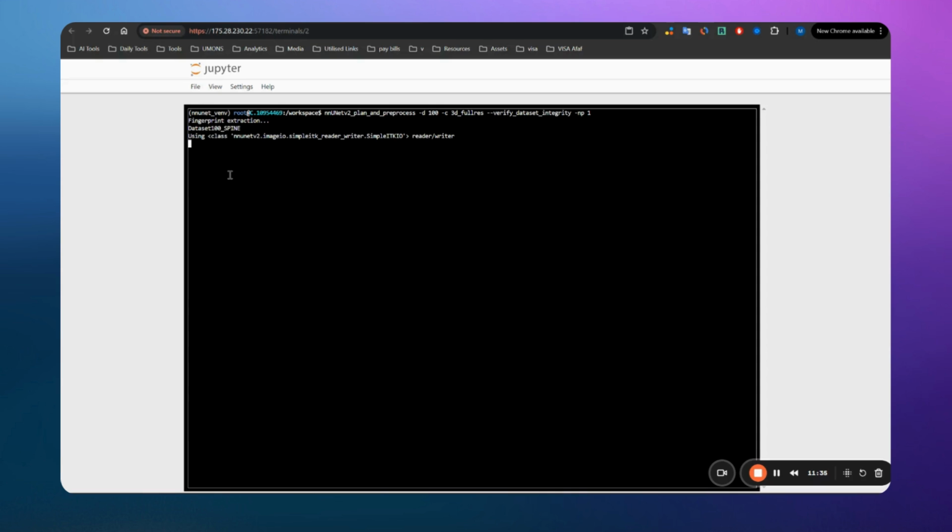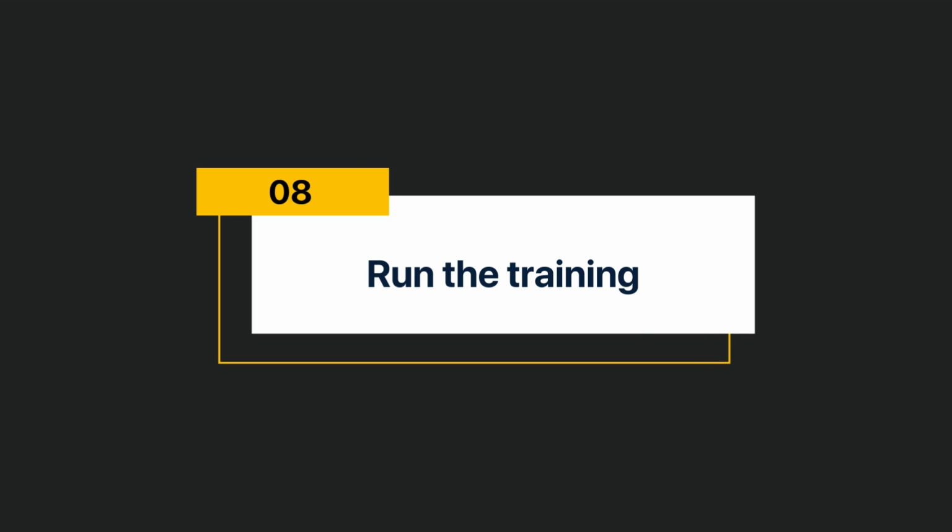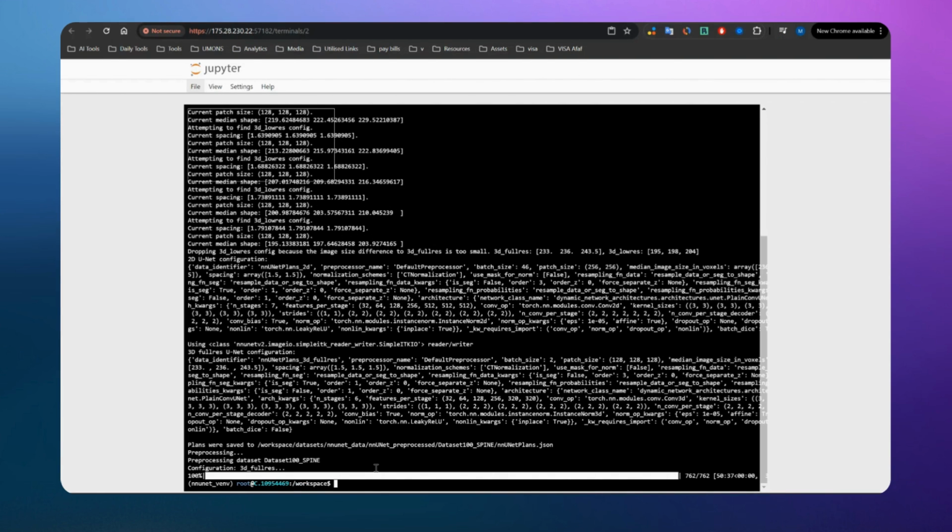It will take some time. I will stop the video until it completes. Whenever the pre-process is done for you, and for me, whenever it is done, I will show you what has been created, and we can go to the training process. As you can see, the pre-process has been done.